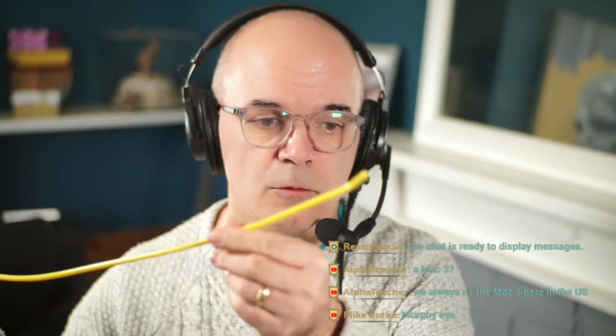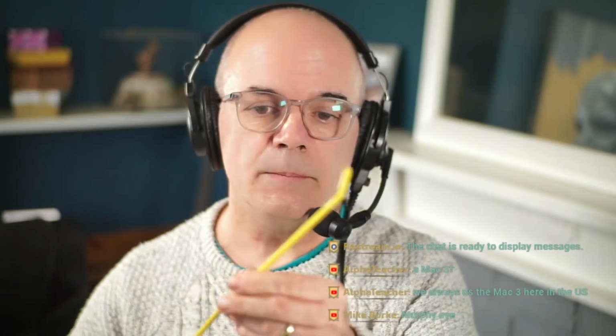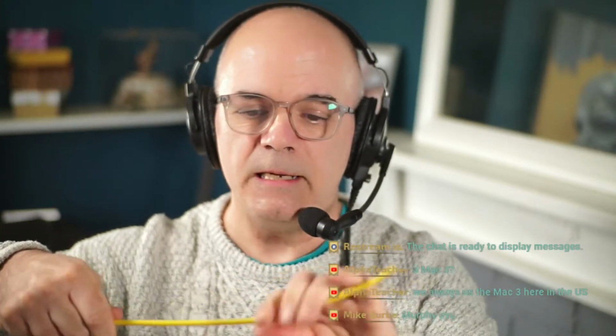But essentially this is going to help you intubate the patient, or help the intubator intubate the patient, when it becomes a bit difficult. Sometimes getting the ET tube around a bit of a corner can be difficult, and twisting it sometimes helps, but sometimes even then you can't get the ET tube down. So often what the intubator will resort to is your bougie. And this bougie can be bent a little. It's not completely bendable, but it can be shaped slightly.